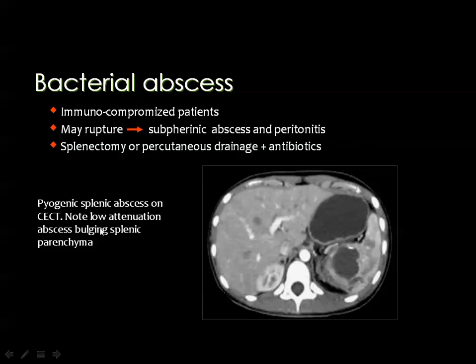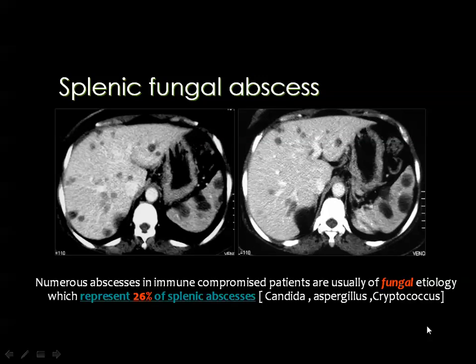And you see here in this post-contrast study, this is the spleen, and this is a marginally enhanced lesion, fluid containing, in the posterior part of the spleen, representing an abscess.